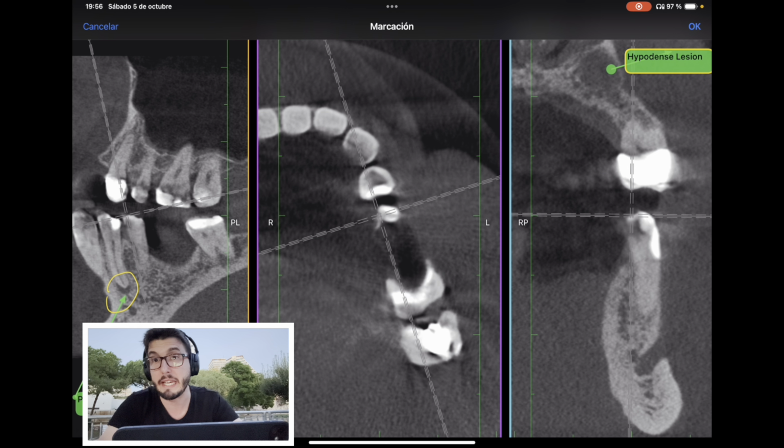And what's the diagnosis? Feel free to pause the video and try your best. For those who are able to do it, congrats, because the first hypothesis is a periapical granuloma. It's well limited, but not like a cyst, not with corticated borders, not round, smaller, and everything. So the first hypothesis is periapical granuloma.